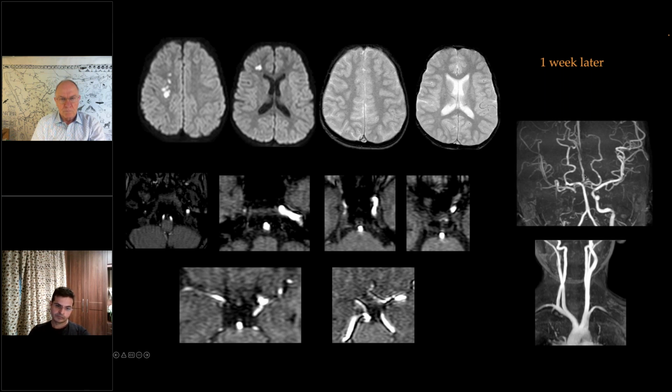Okay. So what is your comment on the ACA? The right ACA is not seen, but the left ACA, I think it is patent. I cannot appreciate any stenosis of the left anterior cerebral artery.